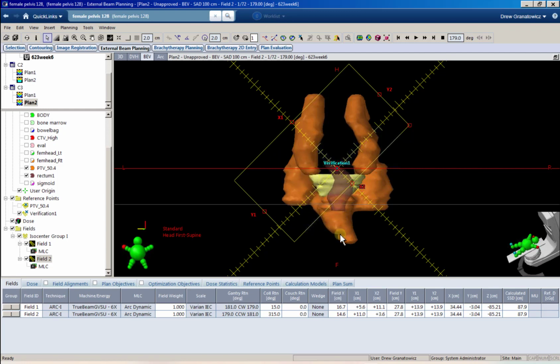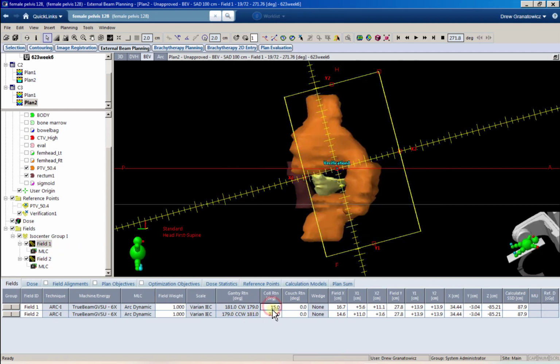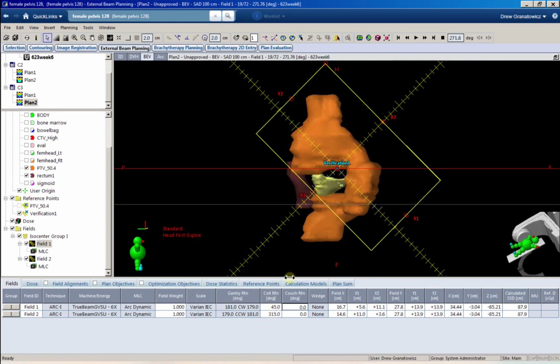Makes sense, right? This PTV down here in this triangle will never get a look from this arc. And then if you do the same thing from this one, if you also have that triangle down here from this arc, you have a big chunk of PTV down here that will never get a look from either arc, right? So you've got to make sure you don't do that too. So you just draw a line straight up and down, and then you want to make sure your jaw is not past that line.